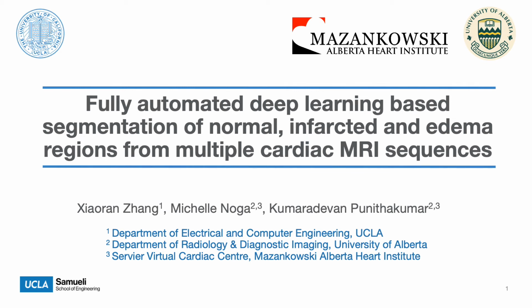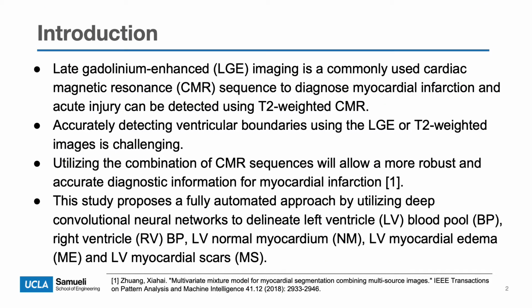In this video, we present a fully automated deep learning-based segmentation of normal, infarcted, and edema regions for multiple cardiac MRI sequences. Late gadolinium-enhanced imaging is one of the commonly used cardiac magnetic resonance sequences to diagnose myocardial infarction, a common cardiac disease that may lead to heart failure.